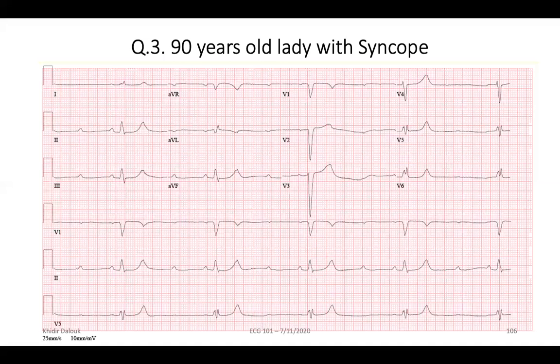In electrophysiology, we always think about what the top chamber is doing, what the bottom chamber is doing, and what the relationship between them is. So you can have atrial fibrillation on top and still be in complete heart block. Usually in atrial fibrillation the rhythm is irregular, but if you see atrial fibrillation with no P waves and a very regular rhythm, this is when you think this is actually AFib with complete heart block. This is a clue that the patient is in complete heart block.